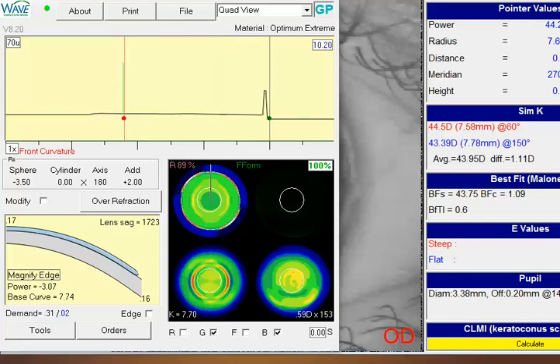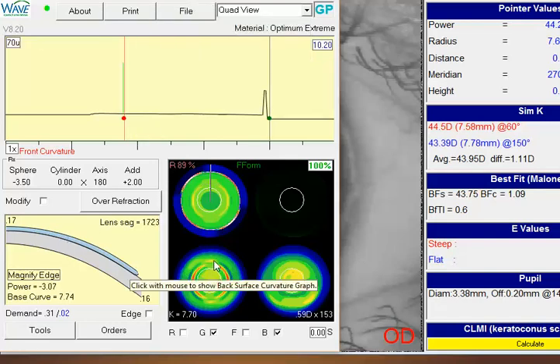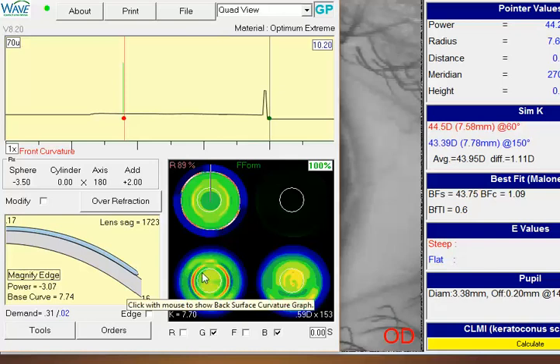You'll get this Wave box. It'll be empty. And click on the file on the top, and where it says load, when you click on load, you'll be able to find that file designated with either an R or an L. Double click on that and that will load it into your active screen. So now once you have it, then you can make adjustments to it and then save it, and it'll save it in the proper place for you. That'll get you back on track.